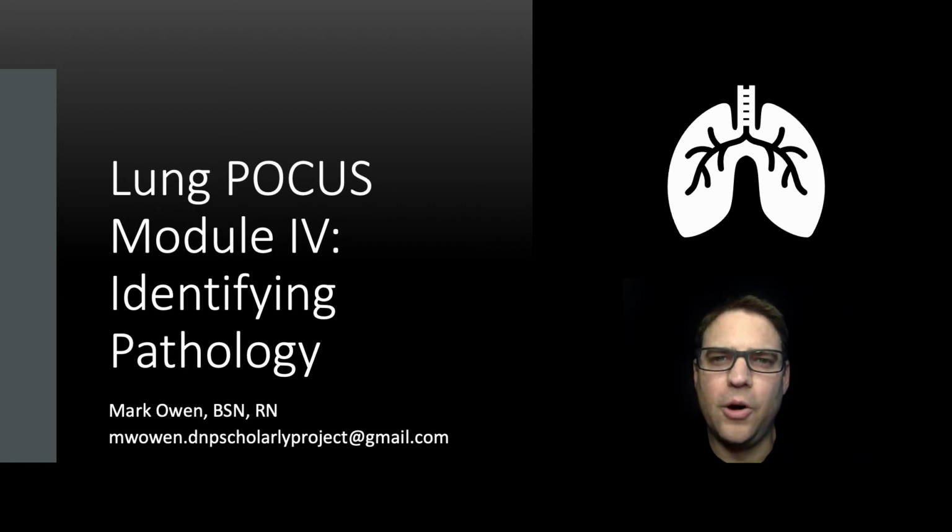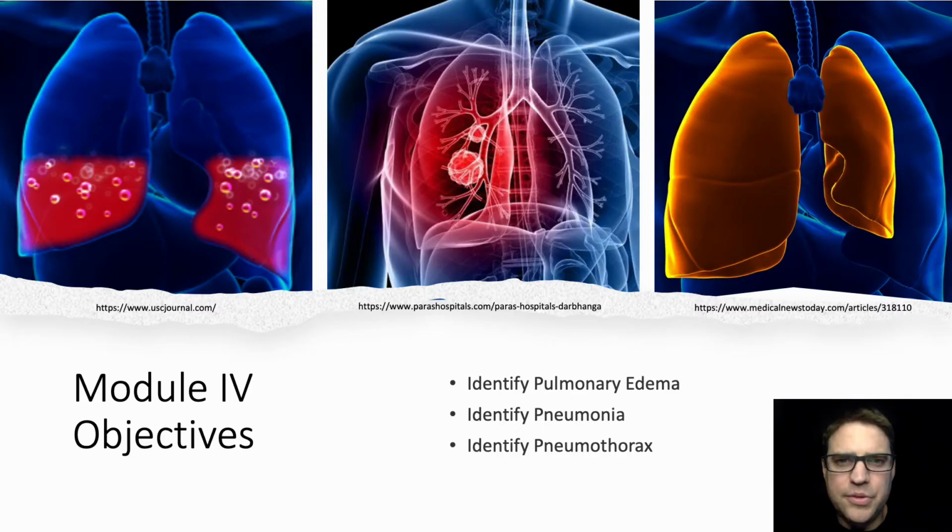Welcome to Lung Point of Care Ultrasound, Module 4, Identifying Pathology. The objectives for Module 4 include identifying pulmonary edema, pneumonia, and pneumothorax.